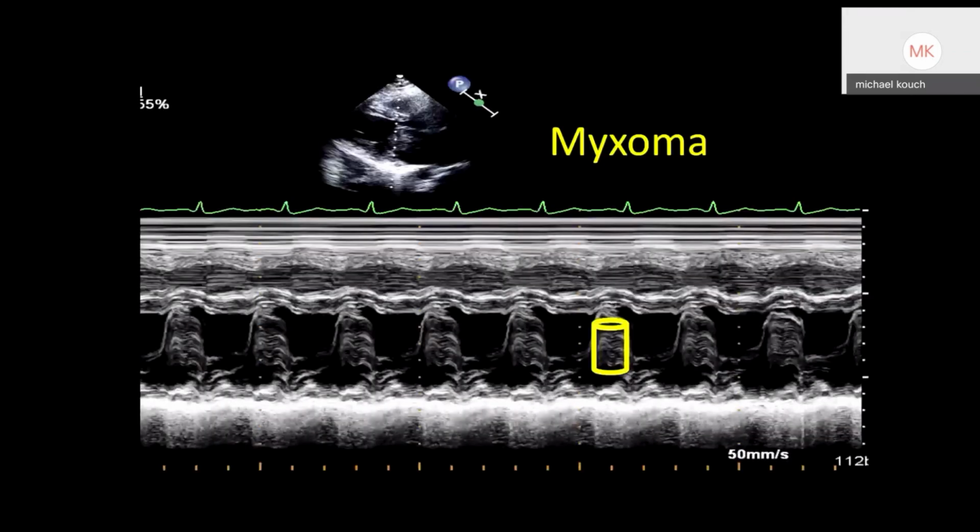All right. So I already gave the answer away to this, but there's something a little bit different. I want you to try to think independently on it, that we have a relatively normal diastolic phase, right? But again, when we try to look what's abnormal in this picture, we notice that this area, which is normally open, right, and black, is filled in with white. So there's something that's moving into this empty space that's normally there that the M mode is picking up.